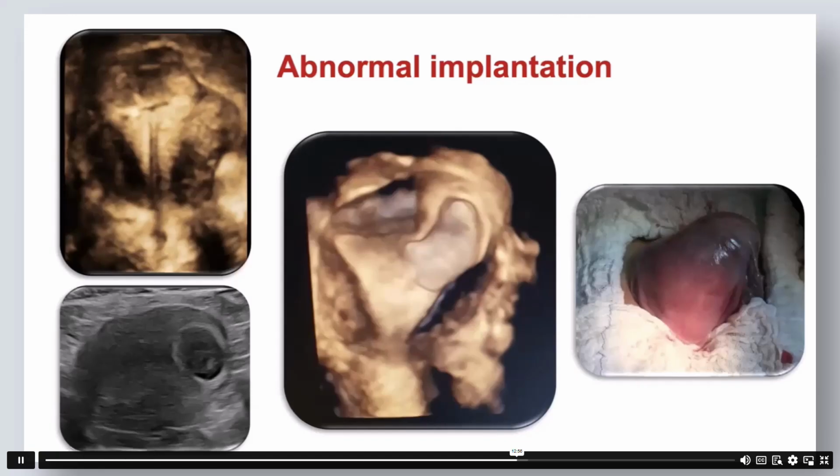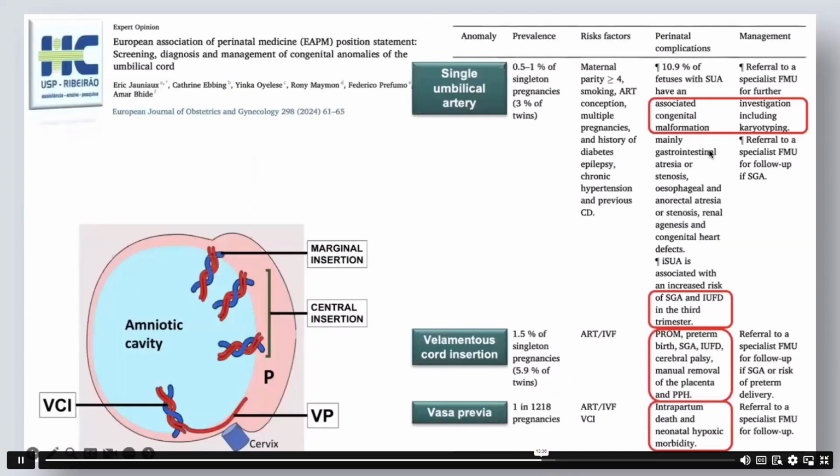This is also a cesarean scar pregnancy, but not on the C-section scar region, but on this previous uterine surgery. So if the patient has a previous uterine surgery, we should be aware of that and look for signs of abnormal placentation. This patient had an uncomplicated spontaneous miscarriage, but if we haven't seen this, it's another patient that had a vaginal delivery, and we were not able to remove the placenta without doing a laparotomy. So we need to know it before delivery.